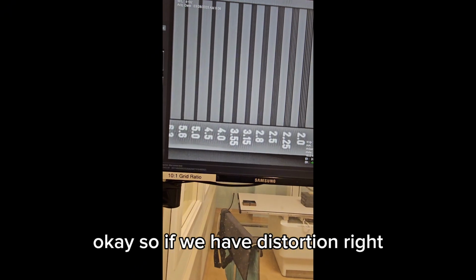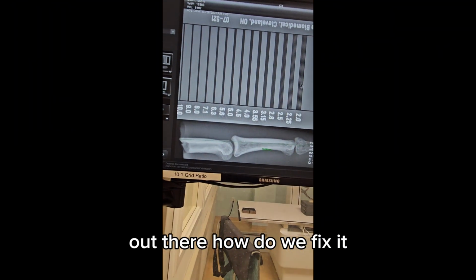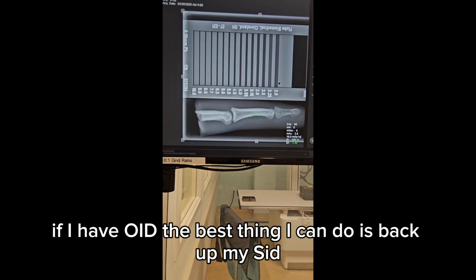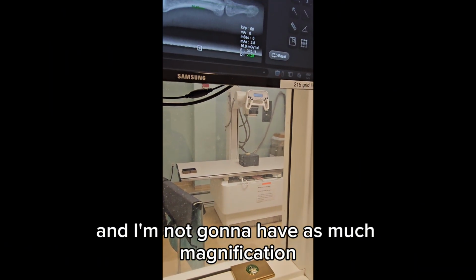So if we have distortion, if we have OID out there, how do we fix it, right? So think of the flashlight, right? If I have OID, the best thing I can do is back up my SID, and therefore I'm going to have a larger SOD, and I'm not going to have as much magnification.